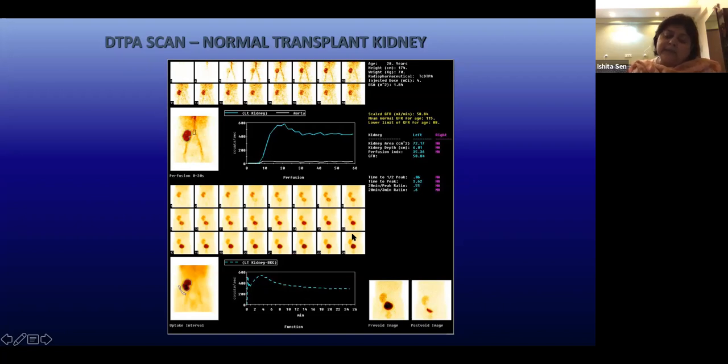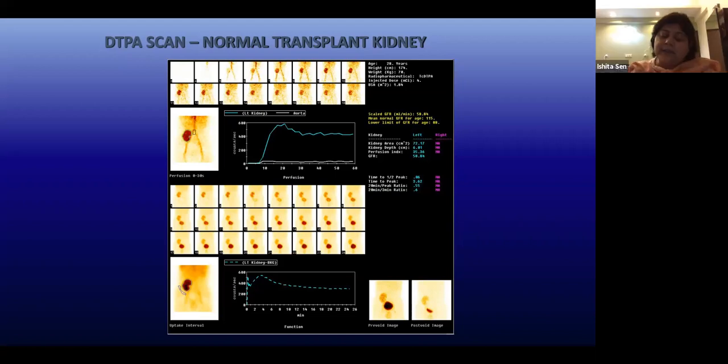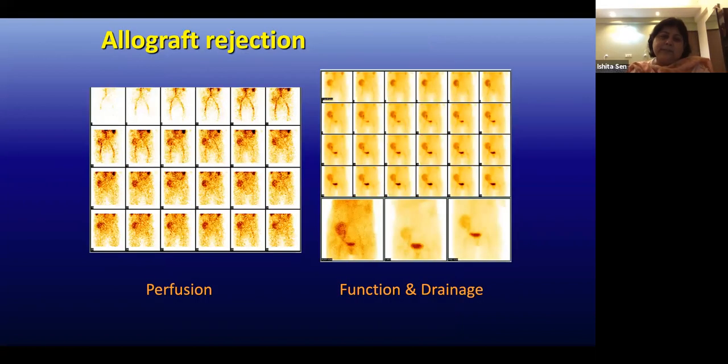Ideally, you should do a MAG3 or an EC in these kinds of cases because the extraction is better and there is a rapid excretion of the tracer, and you get a very nice curve with this, and you can actually assess the function. Also, in most cases nowadays, a renal transplant evaluation is done where a leak is suspected. And in those cases also, it is important to have a tracer which is rapidly excreted so that you can actually see the site of leak.